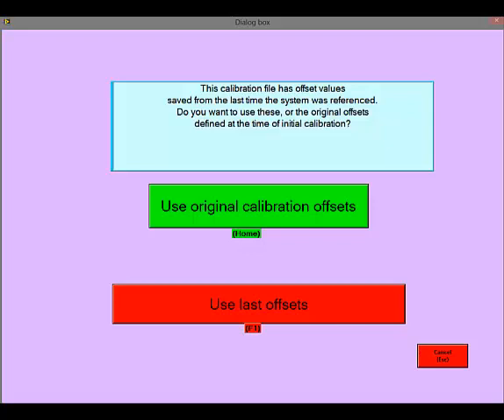If the catheter is not in the patient, generally you should elect to start a new study and perfuse underwater in the usual way to set the atmospheric 0 reference pressures.